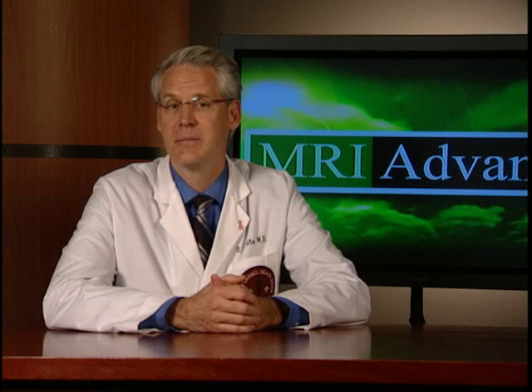As we have discussed earlier, current breast MRI exams present a large volume of image data for the interpreting radiologist to organize and evaluate. We feel that it's critical to develop an organized and reproducible approach that you can follow with every case. A CAD system can facilitate this process. In this section, we will show you our approach to each case and how we organize the data presented.